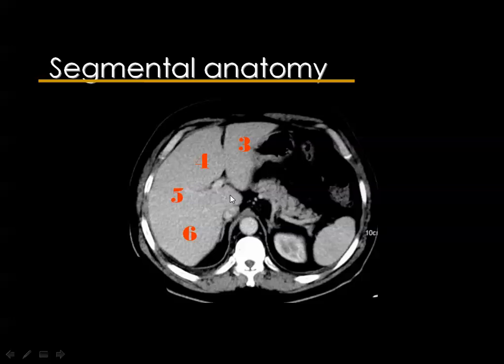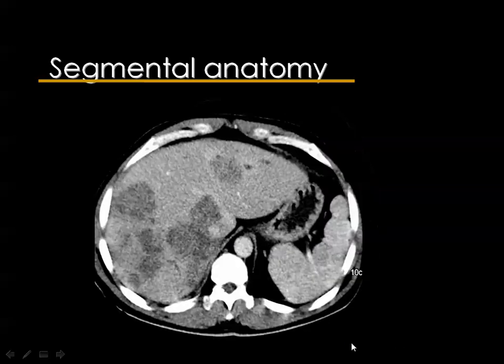And you remember that the part of the liver between the portal vein and the IVC represents segment number 1. Then if you look here, you can see there is no splenic vein, there is no pancreatic tail, but the IVC is in the fossa in the liver, then you know you are above. The above segments are not in serial; they correspond to segments 2, 4, 8, and finally 7. Then if you want to know the exact position of this lesion, it is in segment 2, and this lesion will be in segment 8, and this lesion will be in segment 7.